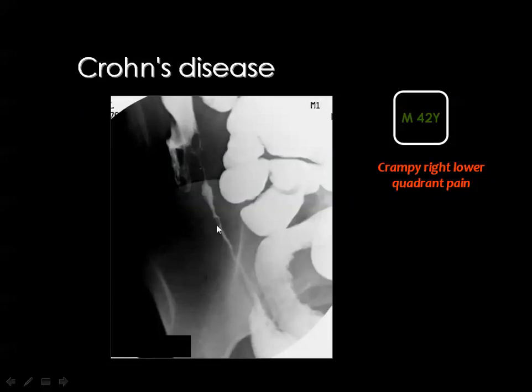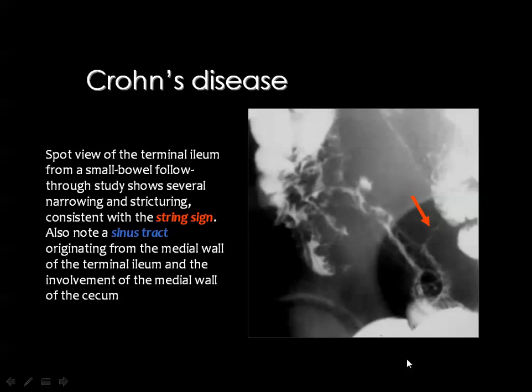This is Crohn's disease affecting the terminal ileum, which is thread-like in configuration. There is marked luminal reduction due to mural fibrosis. And this is one of the complications of Crohn's disease, including fistulae and sinus tracts. And this is the terminal ileum, which is of irregular caliber and irregular lumen as well.